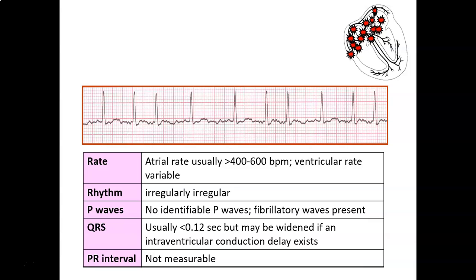Look at this rhythm strip. Rate here, ventricular rate. Which method are you going to apply? Because this is irregular, you cannot apply the big box method or sequence method. Here, use the 6-second strip. For example, this whole strip is 30 big boxes, a 6-second strip. So 1 2 3 4 5 6 7 8 9, so 90 or 80 approximate heart rate, ventricular rate.